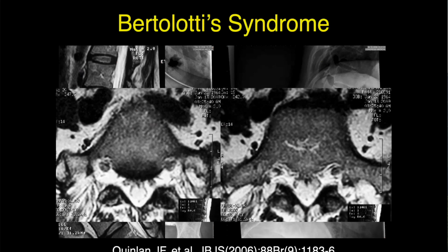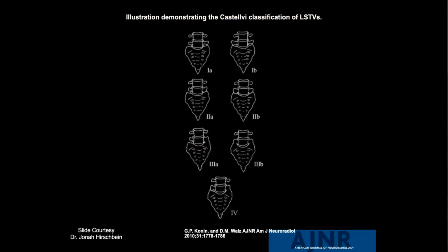So in situations like this, this is one that's bilateral disease, Bertolotti syndrome. And you just kind of need to decide how you want to number things and then make it very clear in your report there's a congenital anomaly. And for the purpose of your report, you're going to label the spine as follows and make it clear. So you could say that L5 bilaterally articulates with the sacrum, or you can say there are 4 lumbar vertebral bodies, and the S1-2 level is congenitally abnormal. But just make it clear each way what it is.